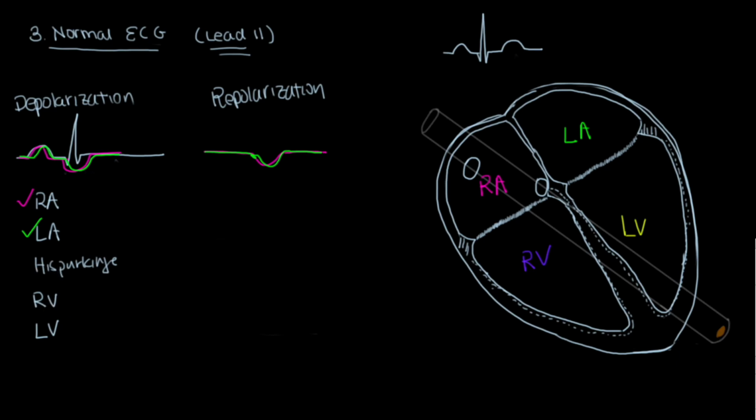Now, the right ventricle. The right ventricle had not been depolarizing at all until we hit here, right? And then we had this go up and down basically, right?